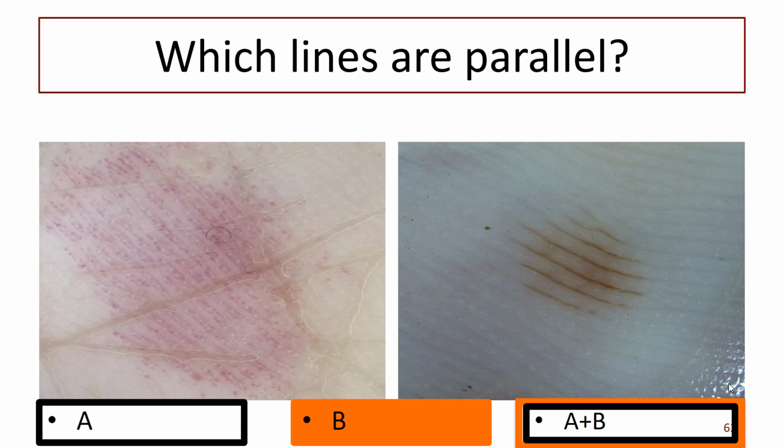Okay, what about this one, Stephanie? Do you have parallel lines? And if they're not parallel, are they branched, are they radial, or are they reticular? Because those are your choices. Oh, no, they're not pigmented, I just said other lines. Okay, so there are parallel lines here. What colour are they?